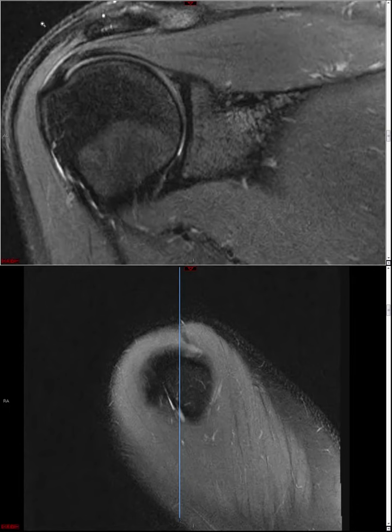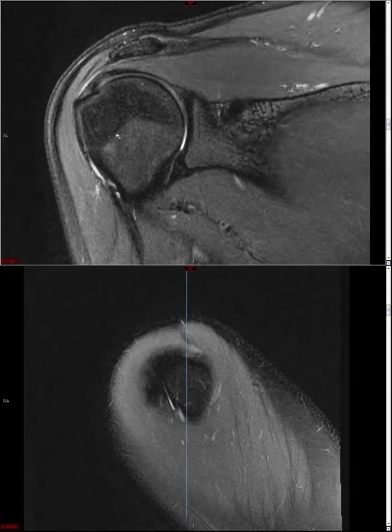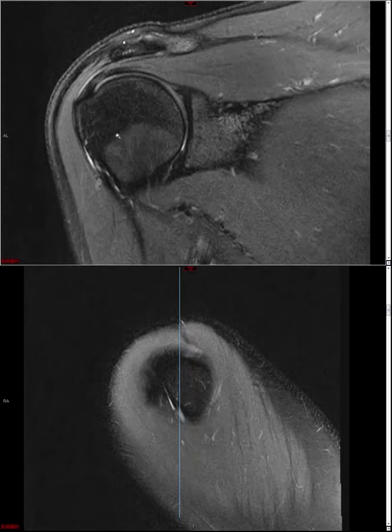Okay, that's going to look like a full thickness tear, because if you have a far lateral sagittal image, it's only going to cut through the tear, and it's not going to show you that, oh, the articular surface fibers are actually intact. So this is the sort of mistake I would make even as a fellow, but I hope that all of you will not make that same error.